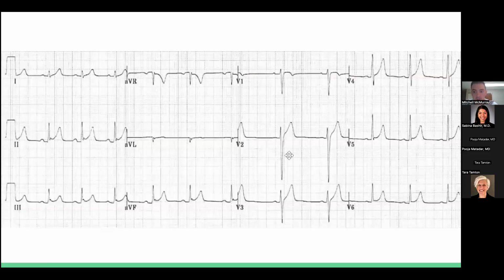Now, what about this one? This one trips people up pretty consistently. I've had some EPS residents walk over and hand an EKG to me that looks similar to this, and I've had people that text me at 3 a.m. while they're moonlighting, for example, that live in my house, that want me to look at EKGs that look like this.